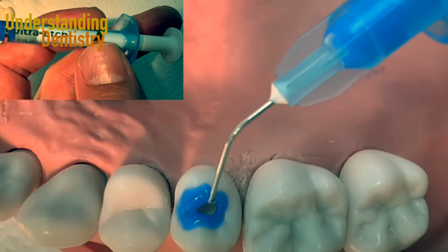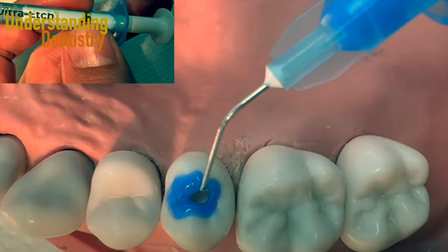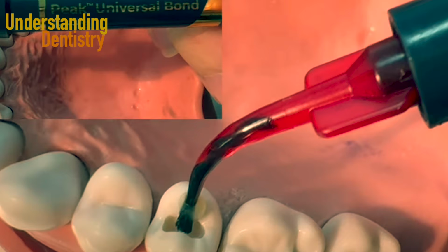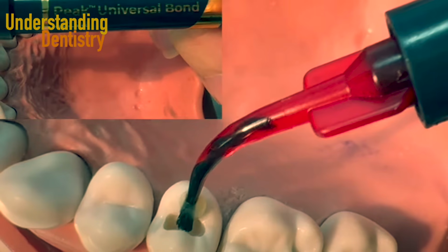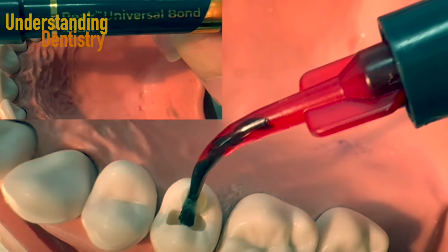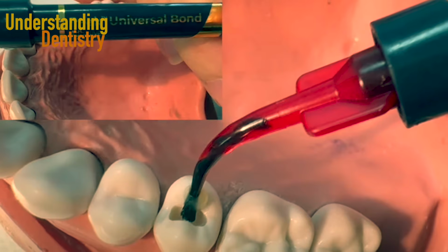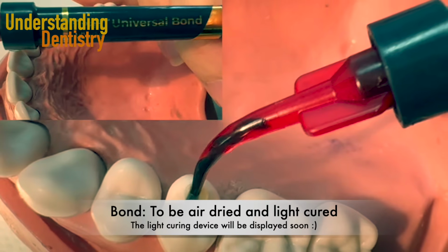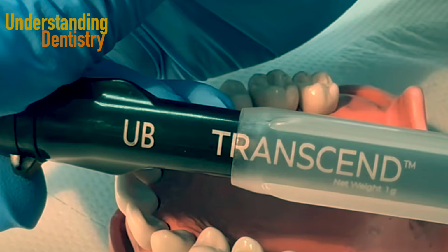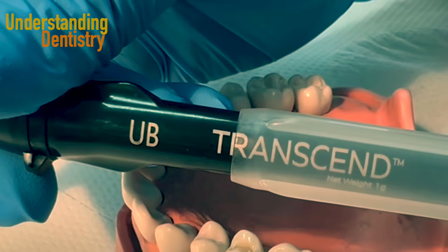So this is the Ultra Etch from Ultradent, the etching material. This is phosphoric acid, and we are going to use this before doing the bond, okay? So that's the bond from Ultradent as well, because you need to apply the bond before a composite restoration, okay? So this material comes already with the tip, the universal bond, but again, there are different materials and different ways of doing this.